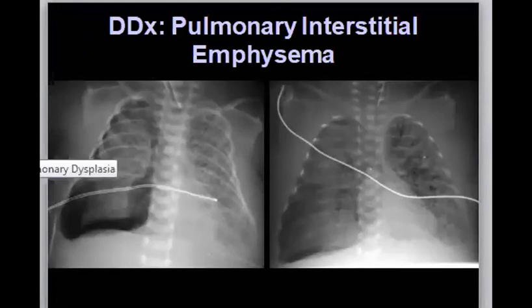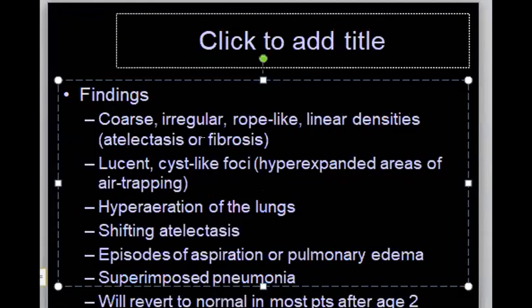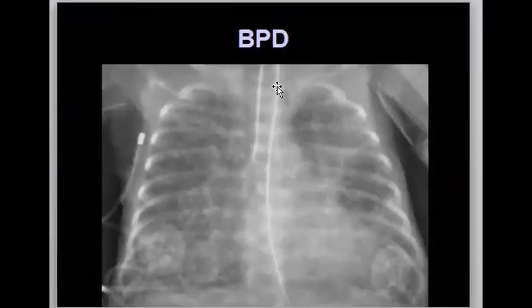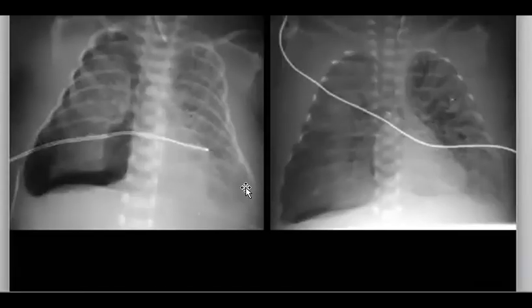Okay, is it clear? Yes. So the findings will maybe be similar to each other, just maybe the history you can know from the history. For example, this one is bronchopulmonary dysplasia. Again, check for the lines and tubes, and then you can know that this is an ill patient, and from the history, if he's taking therapy, then you can reach the diagnosis. For the MCQ, they will tell you about the therapy, the oxygenation, and so on, then you can suggest it.